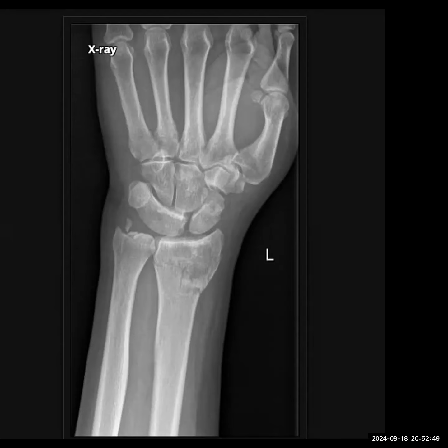Okay, I'm going through other images. I can see that there is evidence of abnormality in the scaphoid in the proximal part. Scaphoid is fine. Okay.